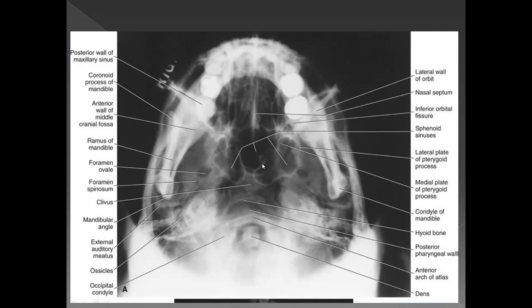So if you wanted to evaluate the sphenoid sinuses for any pathology, this is a view that you could have done. But since the arch is not very clear over here, it's maybe a bit difficult to say. The zygomatic arch you can't really see very clearly in here. So this is why we don't do an overexposed X-ray in such a case, right?